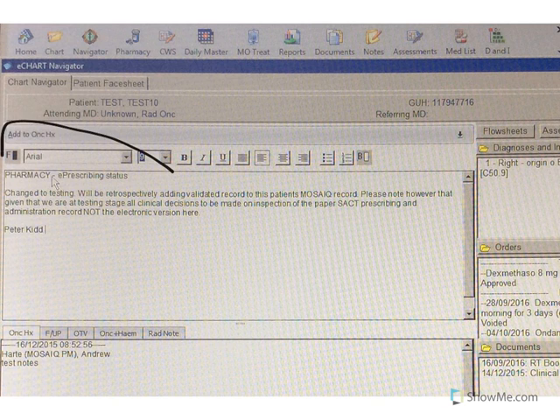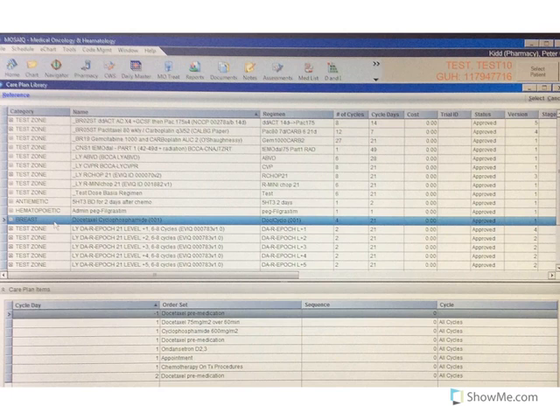You'll also note that on OTV, pharmacy will record that they are populating the record. Here you can see that most of the protocols are in test zone rather than breast. In other words, they should not be used for clinical purposes.